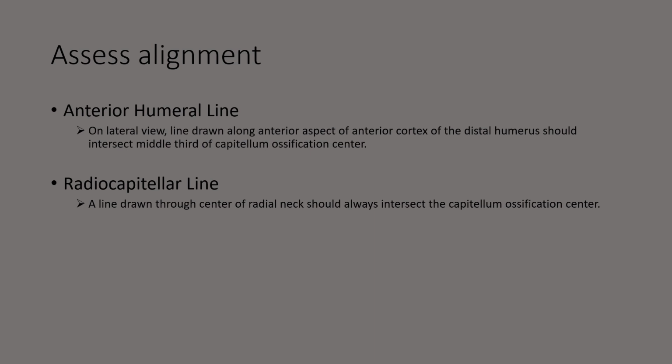The radiocapitellar line is drawn on all views and is a line drawn through the center of the radial neck and should always intersect the capitellum ossification center.